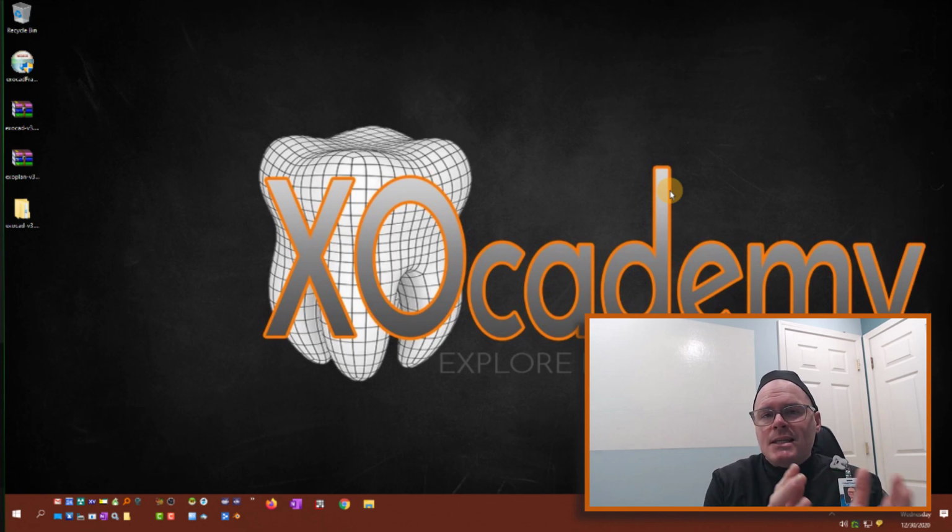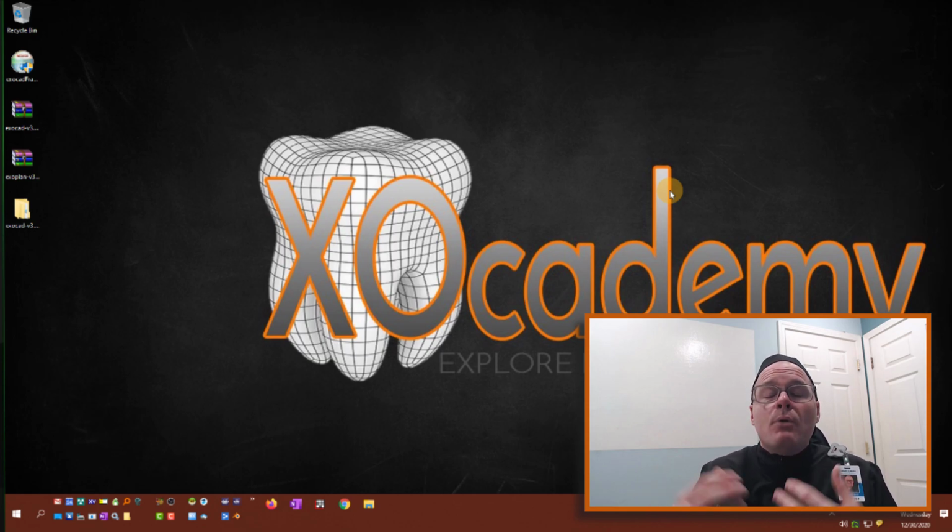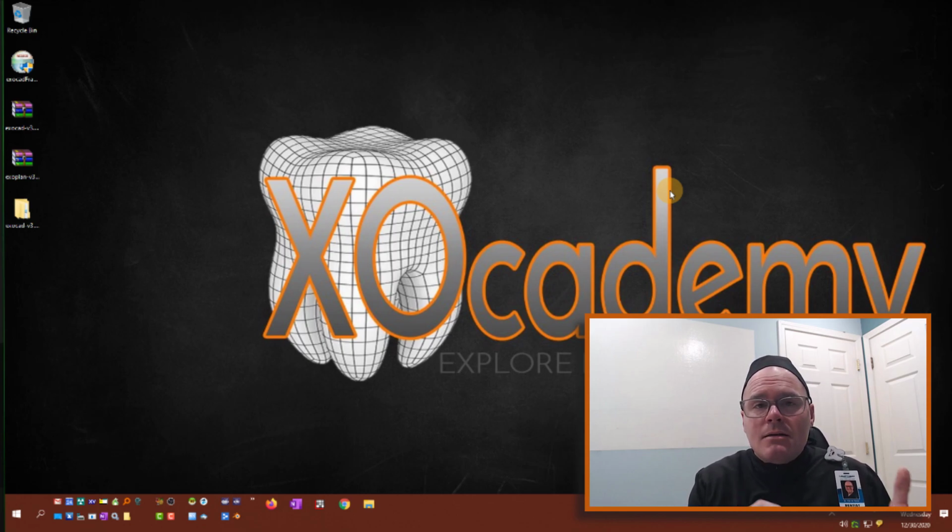You want to make sure that it's the same so it knows what folder to look for and what files to look for, so it finds all of your cases. If you start to make some cases and then decide to change your naming convention, exocad won't know where to look to find those old cases. So even though they're there, they're going to be under a different name. You may have to import them again through DentalDB so exocad puts the right name to the folder.